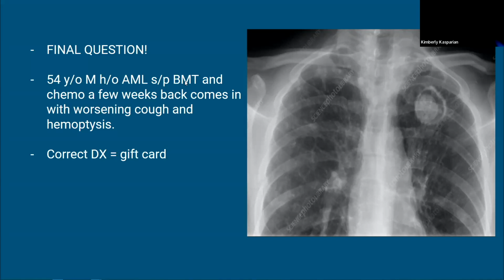I'll answer, but give away my gift card, right? I'll describe it as a granuloma, and I'd be worried about either fungal or mycobacterial, since it's getting a little off in there. You were all over it. So close. Alexander said TB, so something close to think about. Those are great thoughts. Y'all are all around it. Aspergillus, boom, aspergillus. It's a fungal ball.